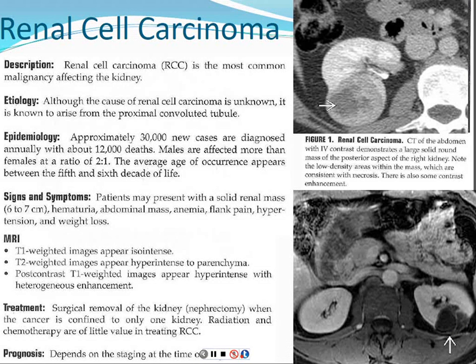And unfortunately, CT and MRI can't tell you until you actually get the tissue out. So these patients will often have a partial nephrectomy these days if the lesion is small enough. These ones that I'm showing you are quite large, but frequently we catch them a little bit smaller, so they can just take out that little piece of the kidney. Sometimes if it's really not involving the meat of the kidney, you won't even notice that they've done it. You'll just see a little divot there, and the patients do quite well. Sometimes it requires taking the whole kidney out.